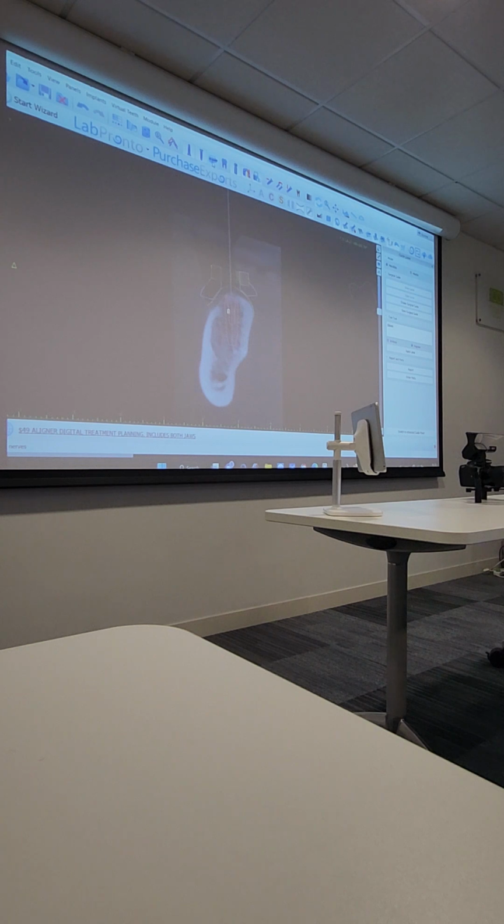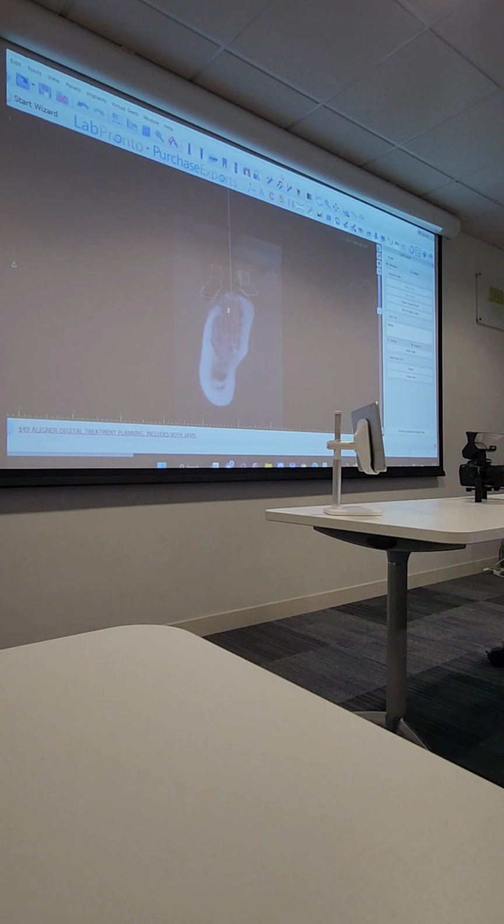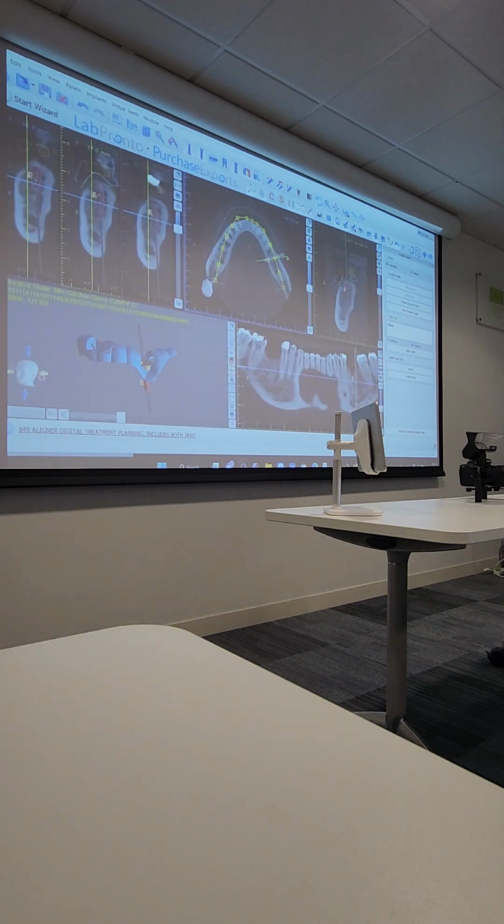Will it let you export the CT scan as a 3D model as well? Export the CT scan. Oh, the DICOM. Yeah. That's a surface. So the surface you can. You mean this? Your STL file. If you select the CT surface, visible. This one. And if you go to export now, let's do it.